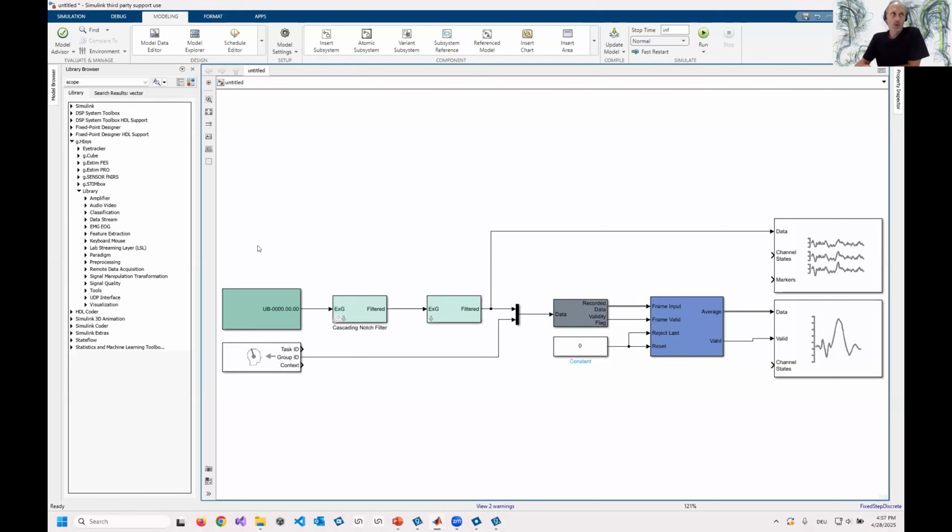g.HiSys. So in this HiSys professional toolbox, we have several hundreds of algorithms and Simulink models set up. So for your experiments, you will always, or most of the time, find a template for auditory stimulation, for example, visual P300, whatever you want to do, TMS experiments. Then you can either just start and stop and use these models, or you can also modify them. And this rapid prototyping environment allows you to very quickly set up a new experiment. So mostly we need a few hours instead of a couple of months or even years for implementing a new paradigm. And we can also help our users to do it together.